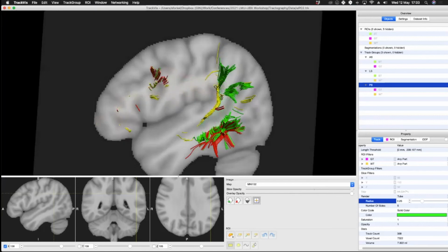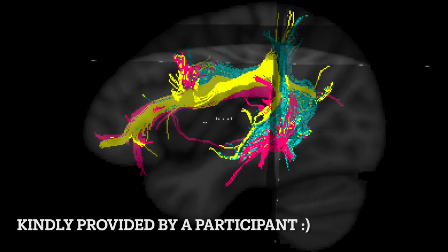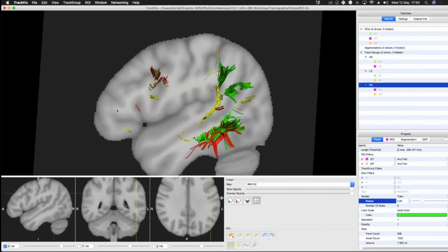So if you bring in the sagittal, ooh, nice screenshot coming through. Lovely, that looks very good. I like the independence in its color scheme. Very good, Sabs.